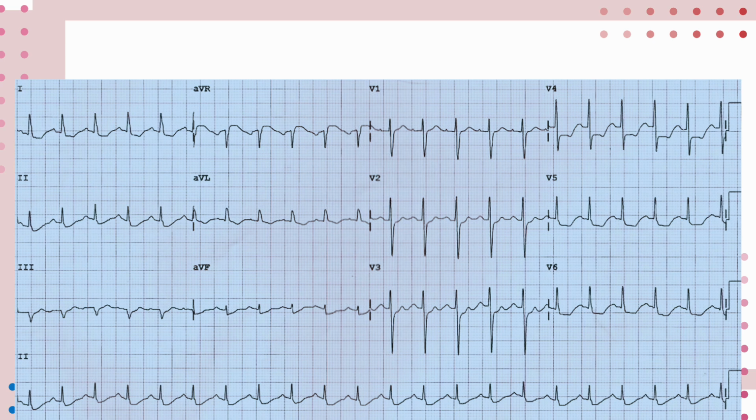So these are the things to consider, and that is why you need to put those things in context. Now, your context is king. Where is this patient, or how is this patient, or for what did they come in? That's very important. Now, I just put up an ECG so that we can do this together. The first thing is, like I said, let's assume I was given this ECG in the emergency department.